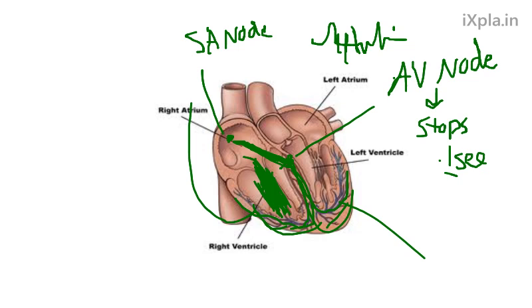The ST segment is just a line. There's really nothing about it. And now, you have the P wave, the QRS, and the S and the T wave. And they measure different parts of the heart.